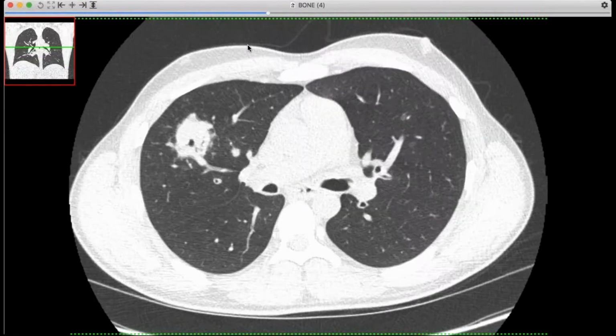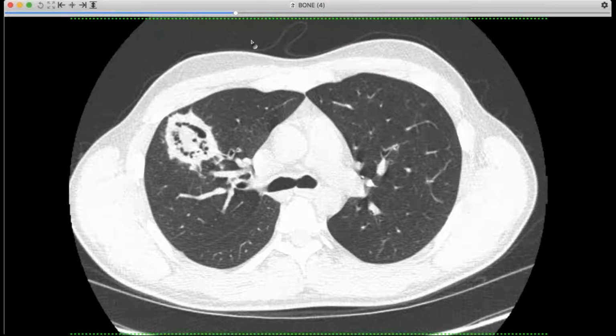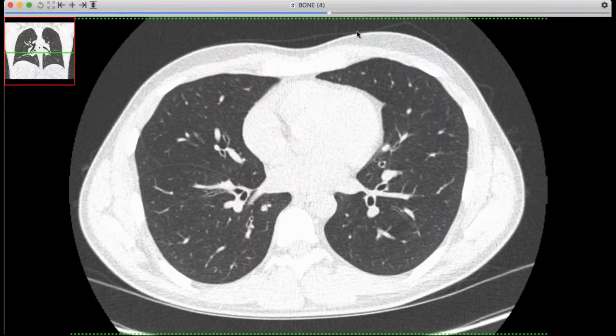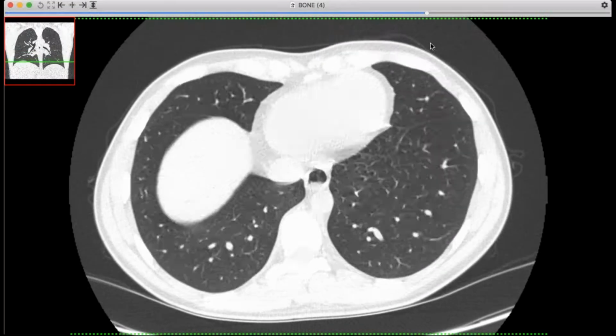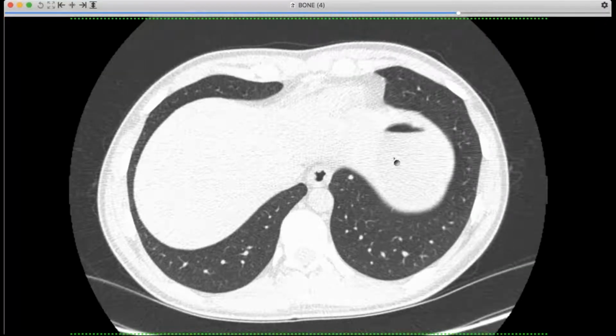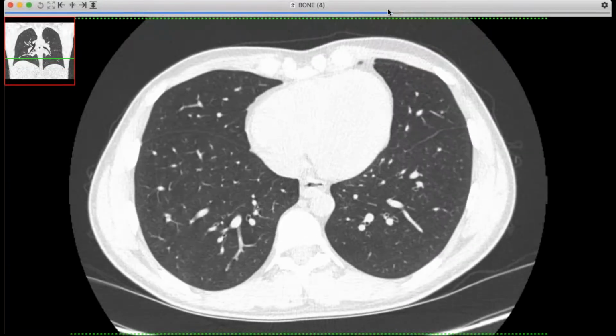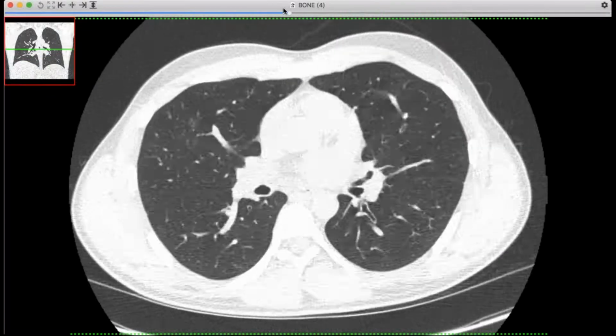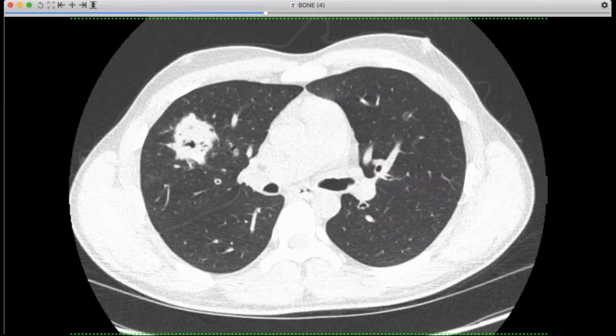So if I saw this in an older patient, some Cheerios. Yeah, do we have, yes, we have a Cheerio. I think there's one in the, where was it? And this one's got a little faint lucency in it. But not the best Cheerios. Maybe some soggy Cheerios or Cheerios with milk. There's one right there.